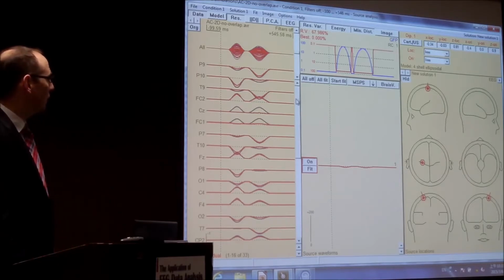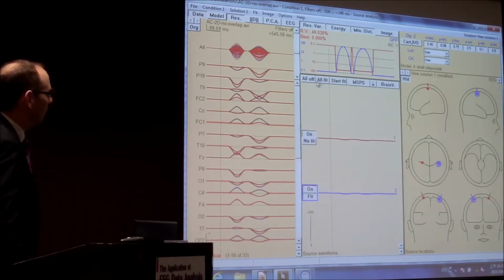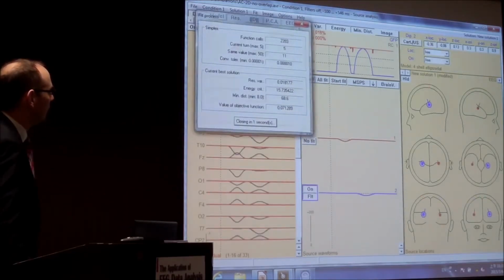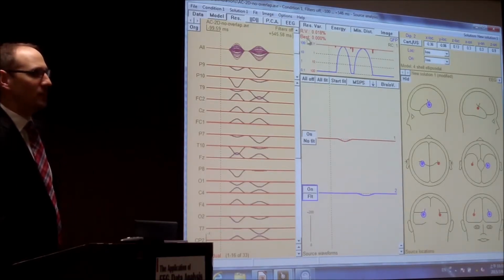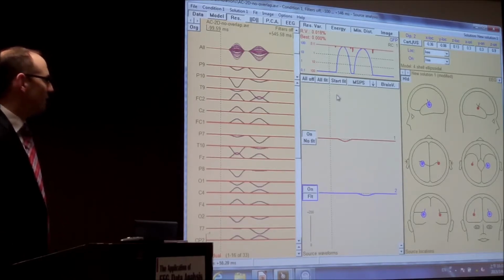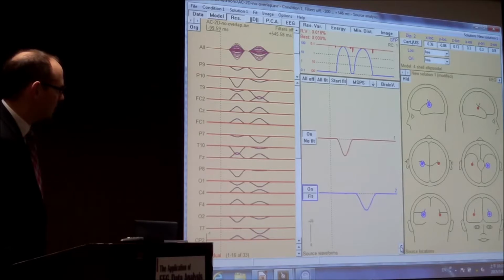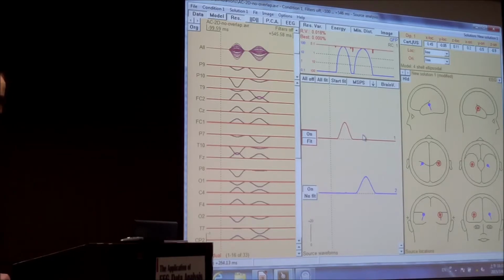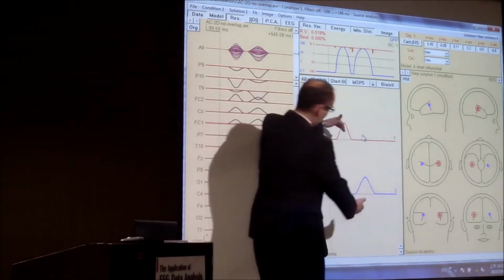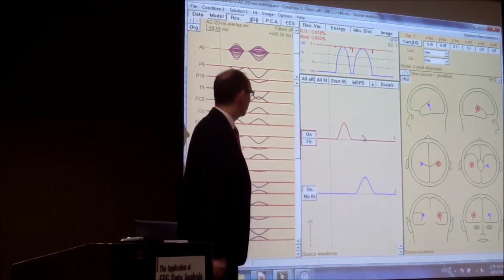In this case, I can show you that we can fit two dipoles, and we can say all fit, start fit, and we have as good as nothing of an unexplained signal. So everything is explained. So as I said, that's simulated data. That is very easy. That is also very easy because these two signals, okay, so I just have to invert them. Okay, these two signals are not overlapping. They are separated from each other. That makes it pretty simple to draw them apart from each other.